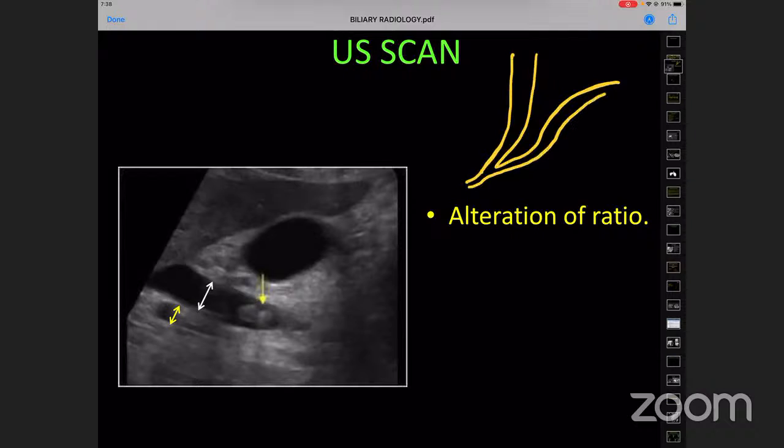Avik, see, at this point, Dr. Bakshi and I, we surgeons all think alike. We are both worried that there is a stone probably that is impacted in the common channel. Dr. Bakshi, am I right on this point? Absolutely. Yep, sure. There is a stone at this point.